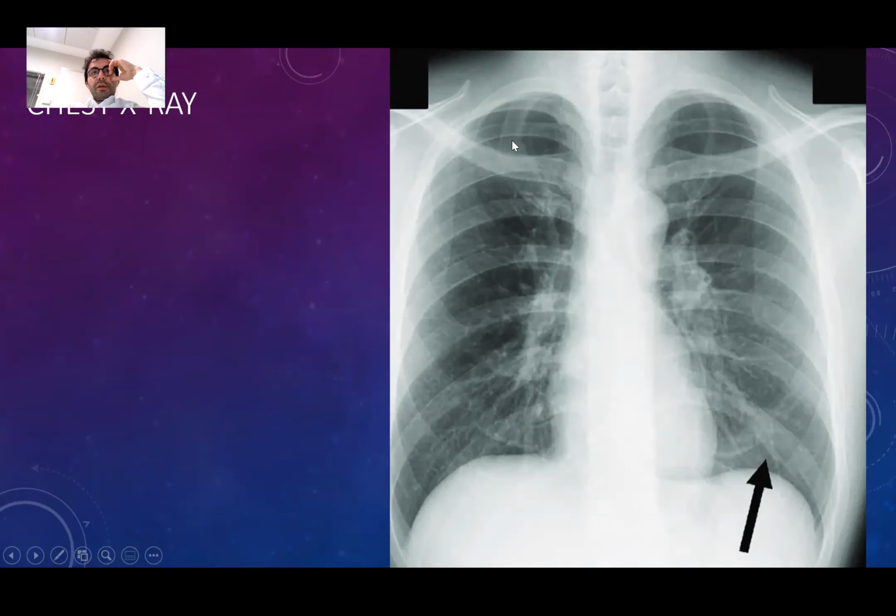I started going in and looking at the lungs. The lung areas are okay. I'm not seeing any pneumothorax. I look at the lungs. They are fine. I don't see any consolidation nor interstitial changes. These are small blood vessels.